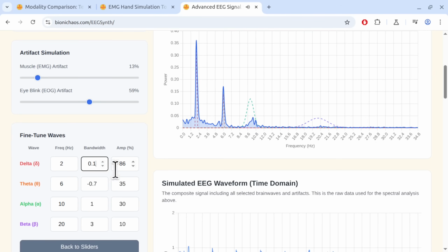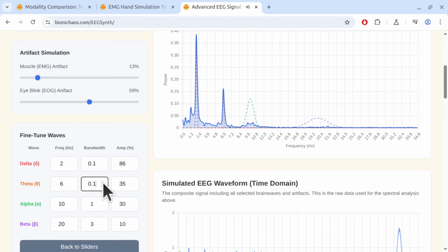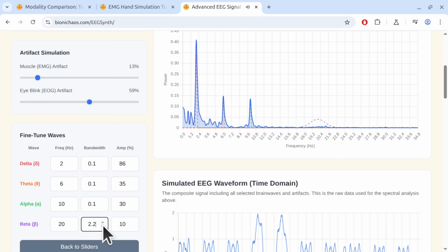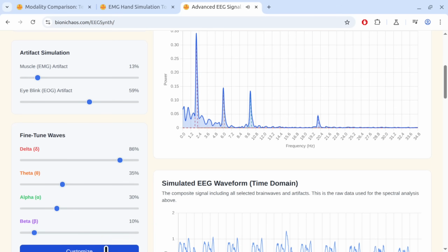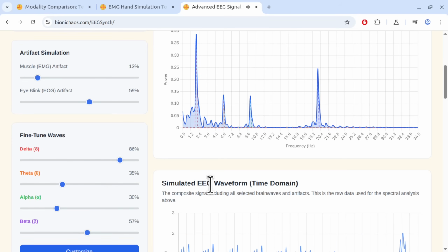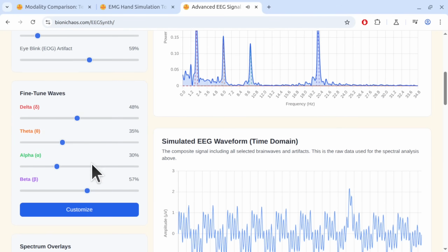So when you then take that final combined interfered-with waveform and run the FFT on it to see its frequency components, the result isn't just those neat ideal curves stacked up. Exactly. The resulting power spectrum, that blue area, is more complex. It's lumpy, as the source describes it. It reflects how those pure components actually interacted over time to create the final signal you see. So the overlays show the ideal ingredients, but the blue area shows the actual cocktail after mixing and interaction.